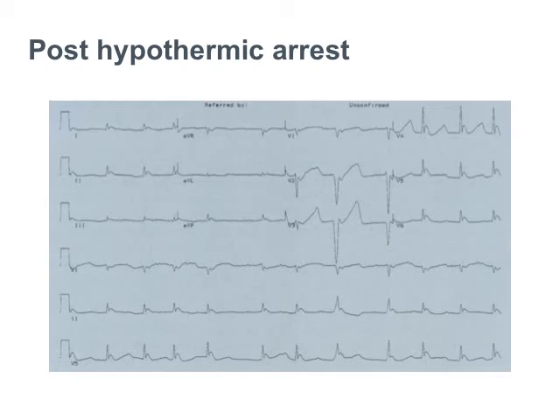All right, changing it up a bit, you've been involved in a post-cardiac arrest that is hypothermic. You've got the patient back with rewarming, and this is the cardiogram. So why don't you take a moment and see what you find.